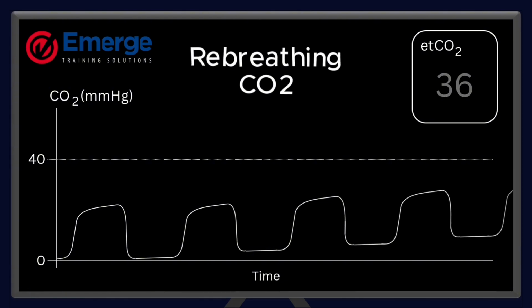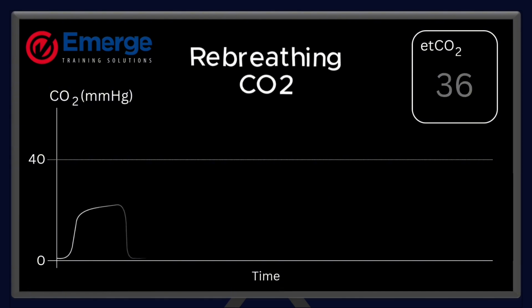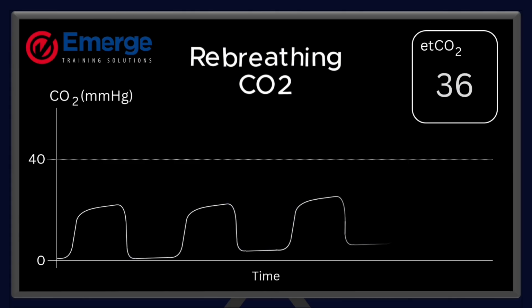When you see this waveform, don't chase a metabolic problem first. This is almost always a straightforward airway equipment issue, not a patient physiology crisis.